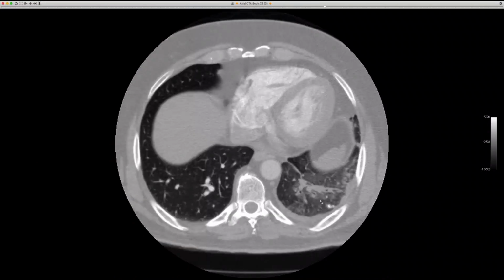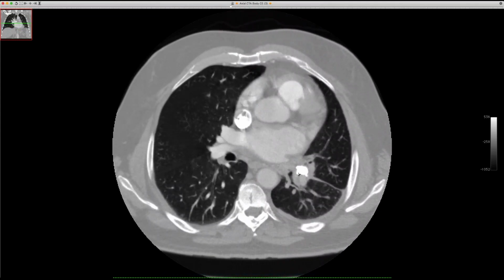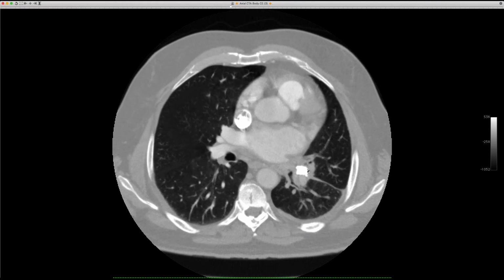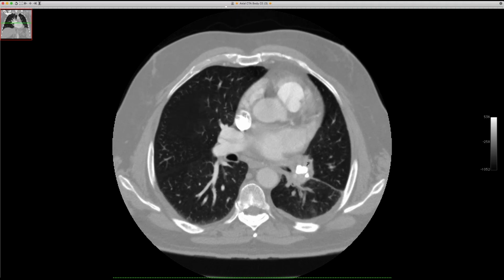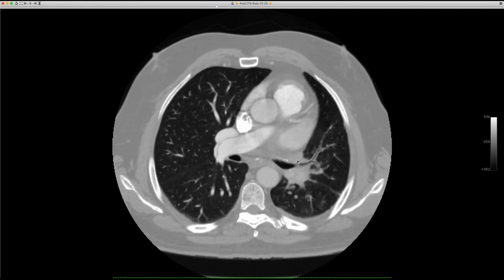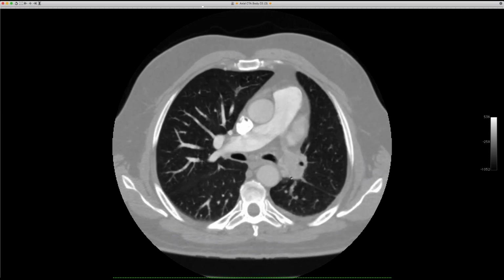So what happens is just a small number of patients get histoplasmosis, and this would have been the lymph node draining that left lower lobe, but somehow they mount an immune response to some of the antigens. The bug is probably long gone, and it causes this progressive fibrosis around usually the lymph node. And you can see there's little tissue in here probably. So this fibrosis just takes everything out with it. The veins go first, then the arteries and the airway typically. You get edema in the airway wall because the lymphatics are obstructed, and there's not a lot to do.